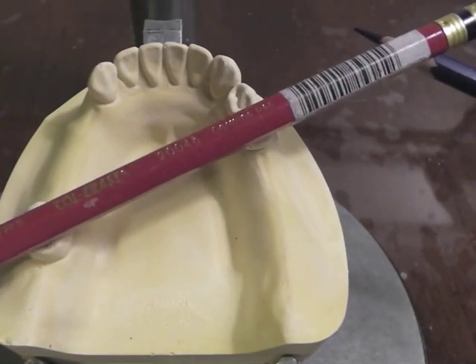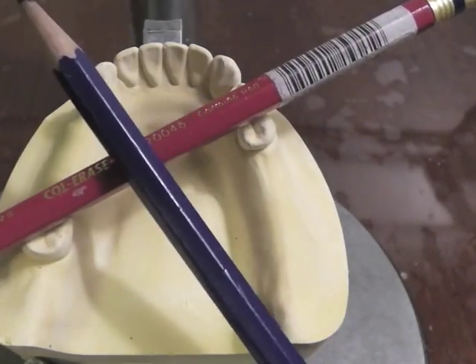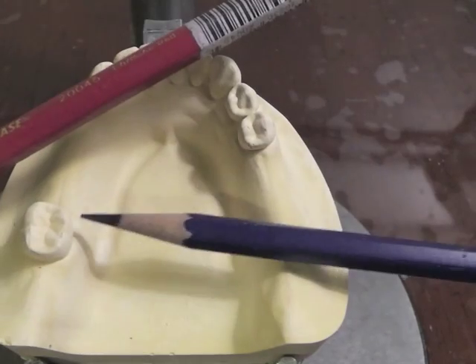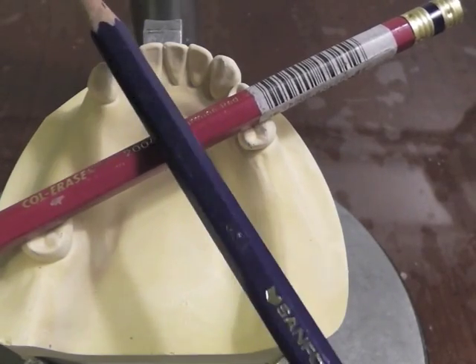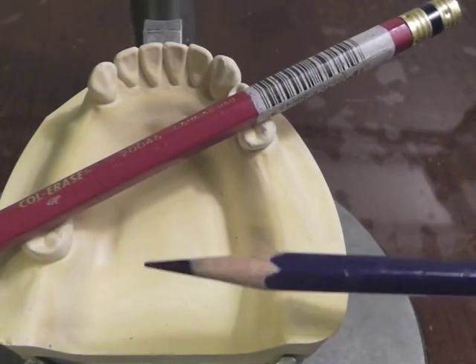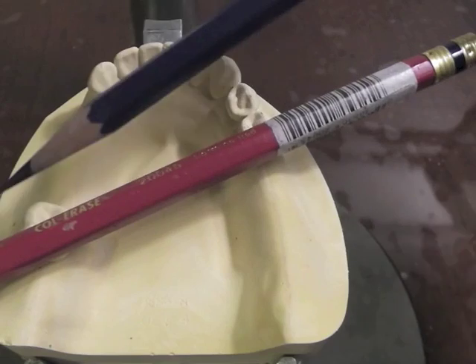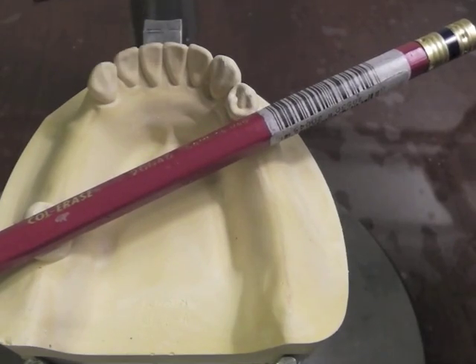The fulcrum line on the Kennedy Class 2 goes between these most posterior teeth, and our partial denture is going to want to rotate around that fulcrum line. We're going to help prevent that rotation, one, by putting clasping on these two, which are considered our primary abutments. When we see this rotation wanting to take place as the patient eats some hard food on this area where we have no posterior support, this partial denture wants to go downward, and in order to prevent that, we're going to put a clasp on this other tooth that is next to our edentulous area over here, and that is a secondary abutment, and we will have a clasp there also.